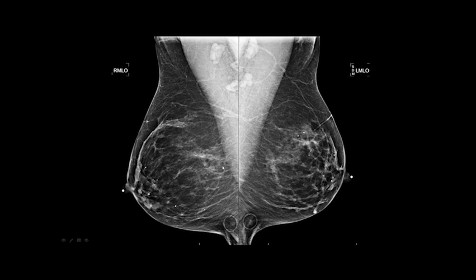You have beautiful IMF here. The patient has a mole with mole markers. That's fine. You can put mole markers on accreditation images. This is a scar marker, BI-RADS 2, benign. They really don't want patients who've had a benign biopsy, but if that's the only thing you got, that's what you could send. But remember, you need permission.